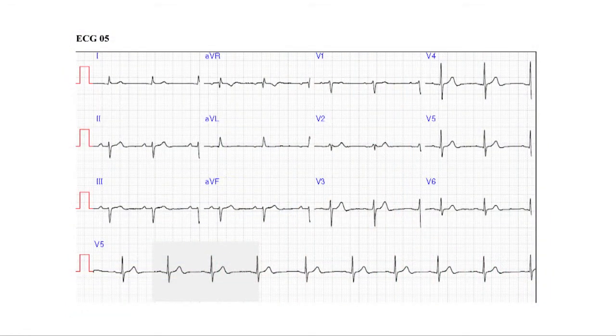In fact, an isolated finding of a left anterior hemiblock, which is what this ECG shows, doesn't necessarily indicate any disease that requires further investigation. If there is no history of any cardiac disease, left anterior hemiblock generally doesn't require any form of intervention. Usually it won't affect their insurance status, and generally what I would do is just note it, check to make sure there's no symptoms in the patient, and then really leave it at that.